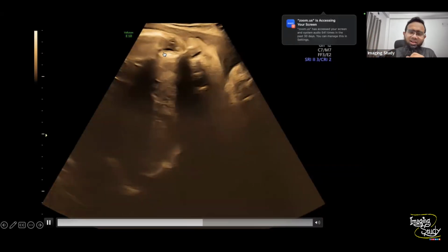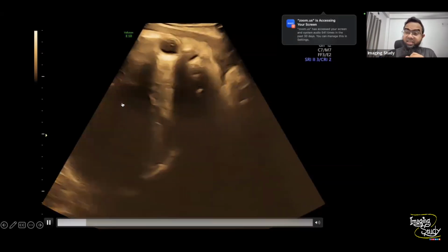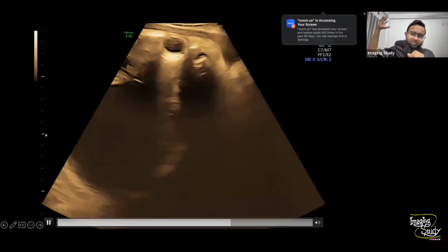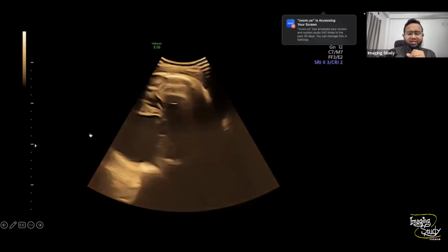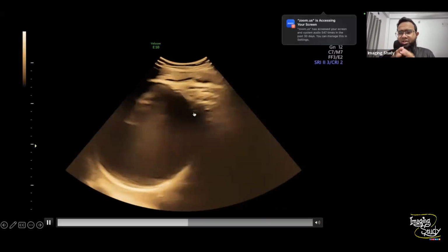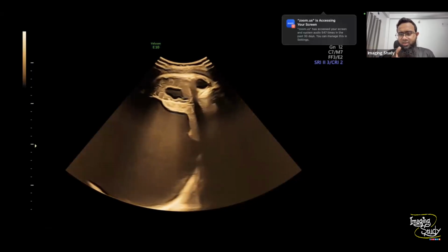The face is very small in comparison with the whole back of the fetal head. This is a hugely sized fetal head, going backwards and backwards, with a huge cystic space at the posterior aspect. Let's see it from another view. You still can see the cystic area, but we still don't know how it formed or what the lesion is.